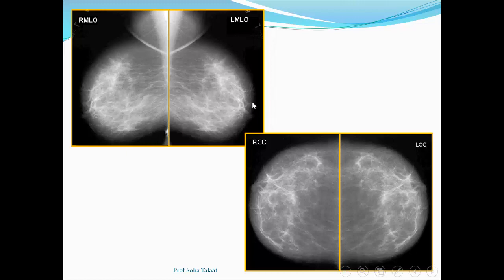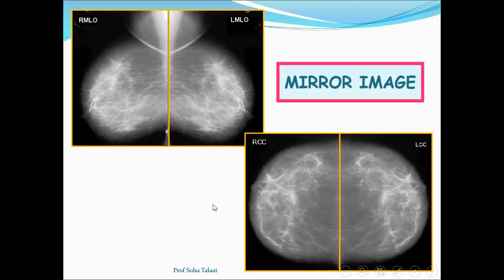When we try to see the nipple and areola, especially on digital mammogram, you can just lower the window slightly in order to see the nipple and areola in a good way. Here there is the retromammary fat. It's the no man's land. We must here not find any glandular tissue. If you find any asymmetric opacity in that area, you must take care.